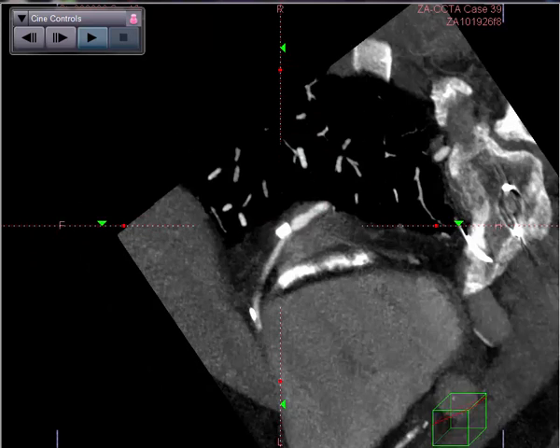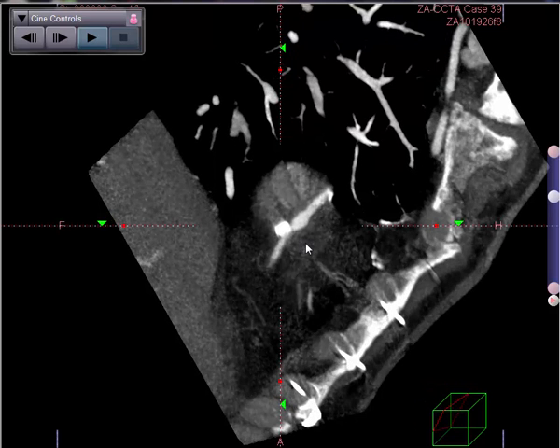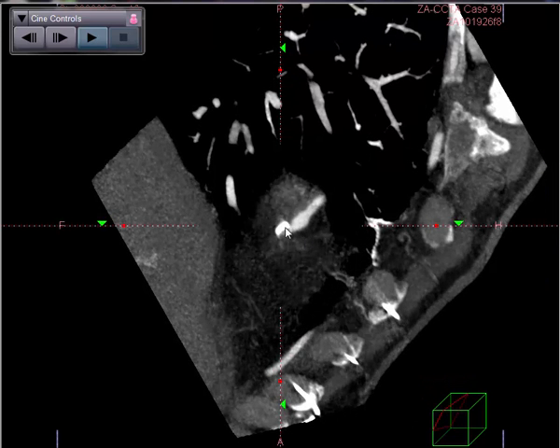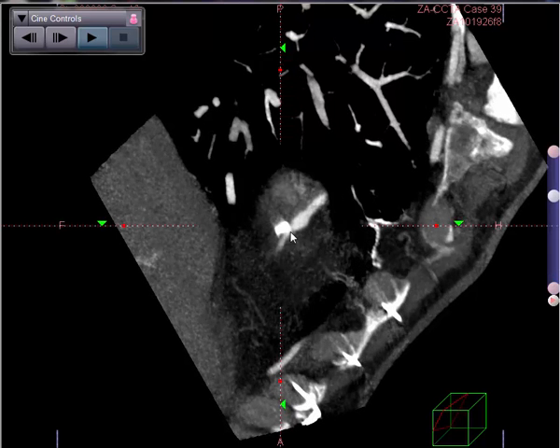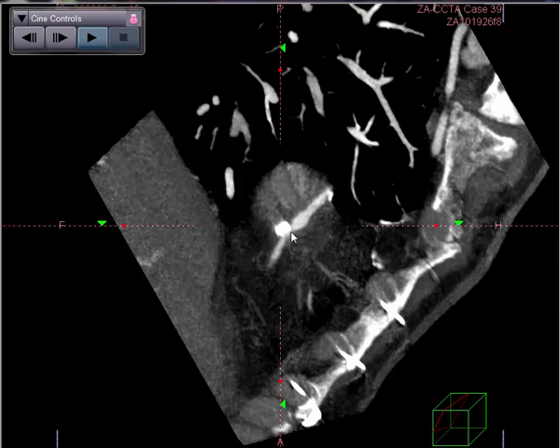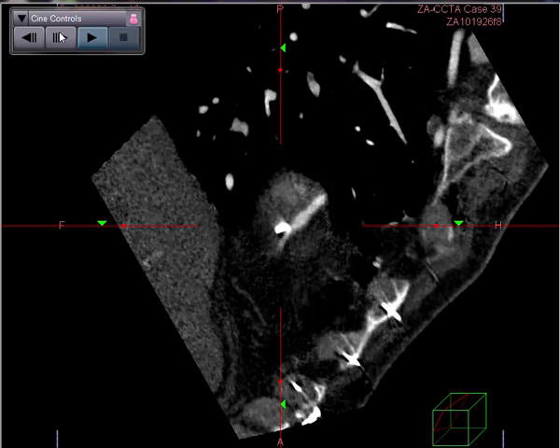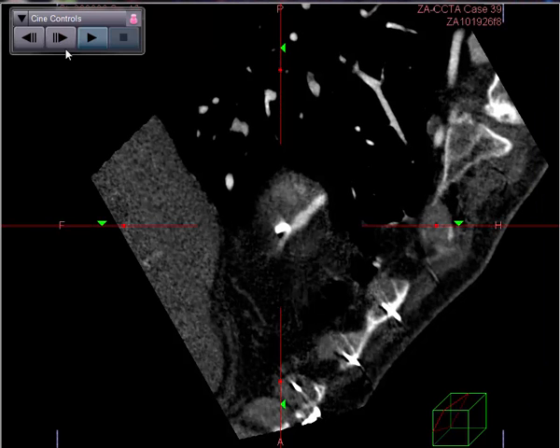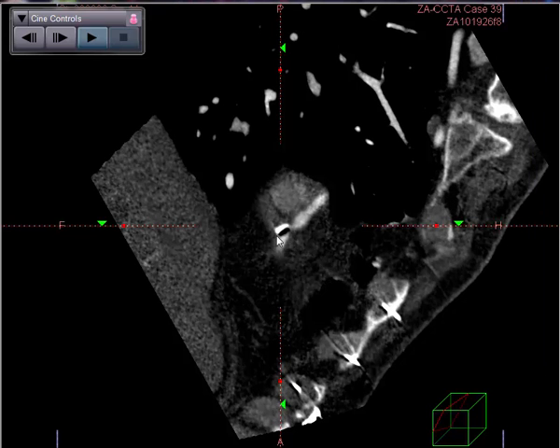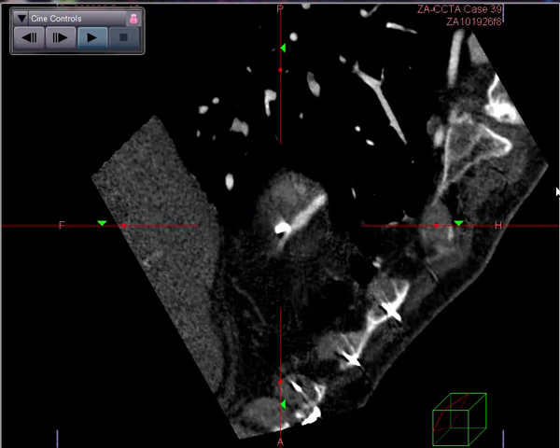There's an area of very dense plaque, actually very dense clip, surgical clip, not plaque. And let's do a little MPR in that area, switch to a different phase. Not easily. You can see here, this is a beam hardening artifact, the very blackness next to the intense whiteness of the surgical clip. Let's go back to a 5mm MIP and continue down.